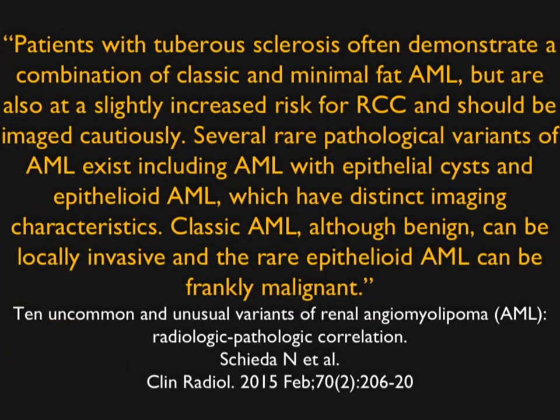Now, there was an article by Shida, 10 Uncommon Unusual Variants of Renal Angiomyolipoma. Again, the big challenge is this article was speaking about, can you always separate things from renal cell carcinomas? I think always is a big word. It can be difficult at times, but I think when you start looking at the images, I don't think it's that difficult.